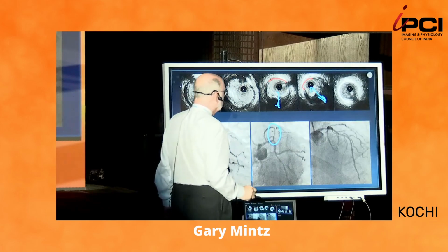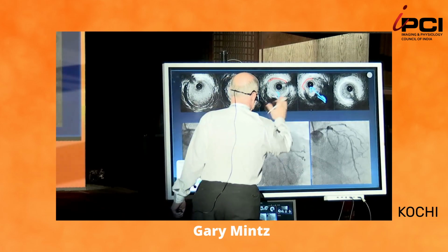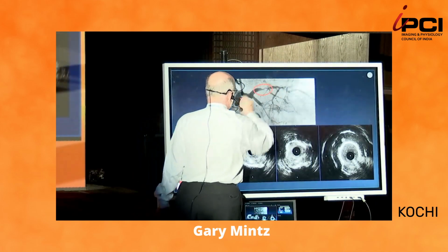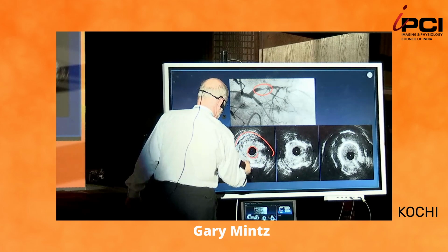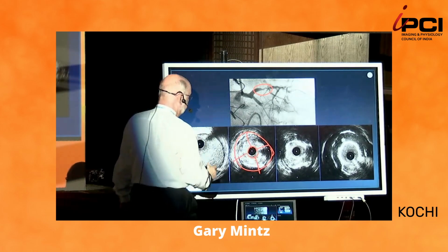So this is totally eccentric plaque. Is this concentric or eccentric? And it's totally concentric. Here's the lumen, here's the adventitia, it's concentric.